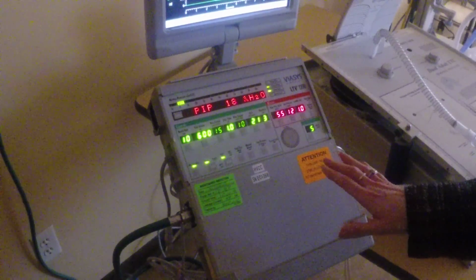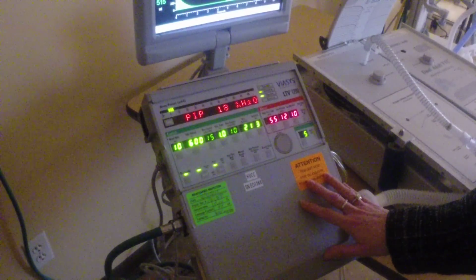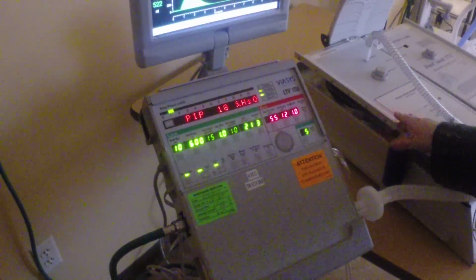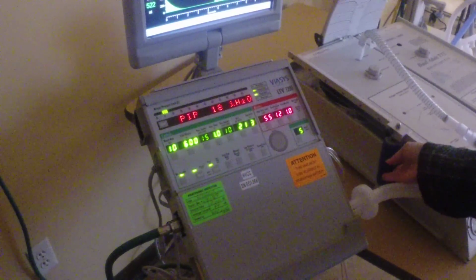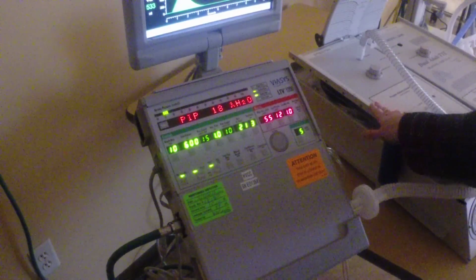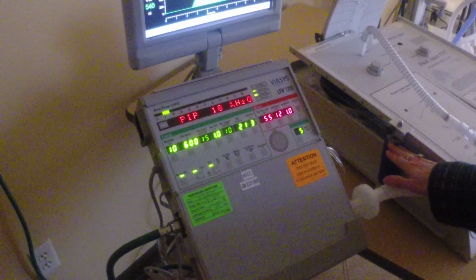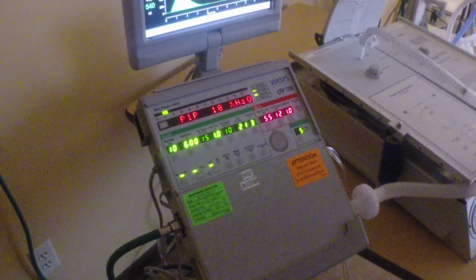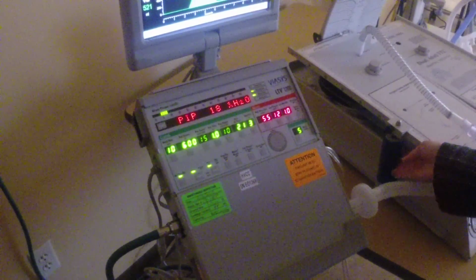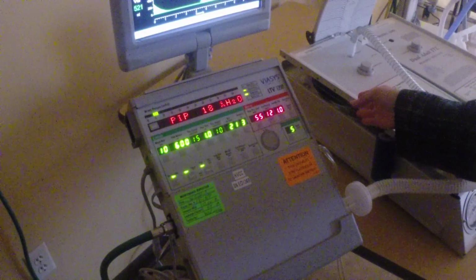Now we're going to do an example of what changes when the problem is with the alveoli. I can alter this test lung with this spring and make it stiffer. So this spring, moving it to make this test lung stiffer, will simulate a problem in the alveoli. I will not change the resistor or the size of the airways. I will only change the tension on the test lung with this spring.